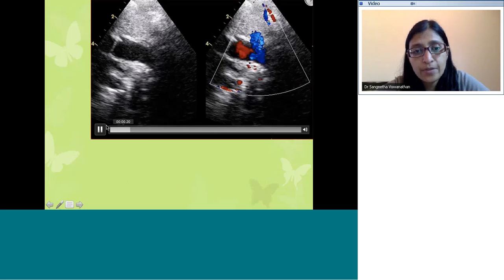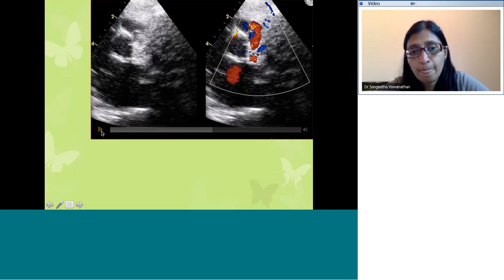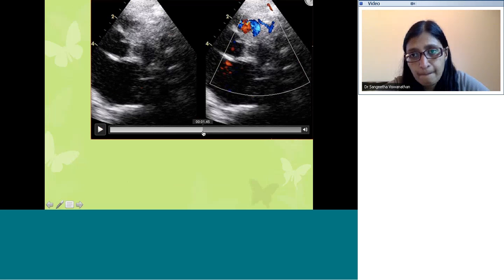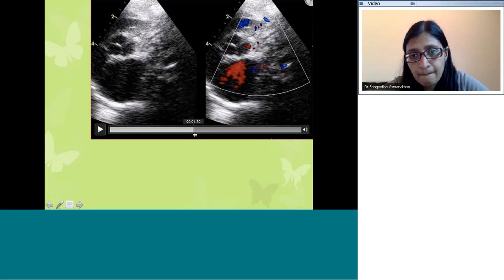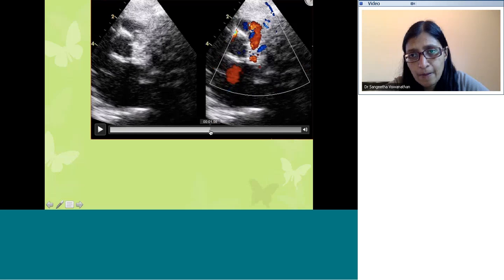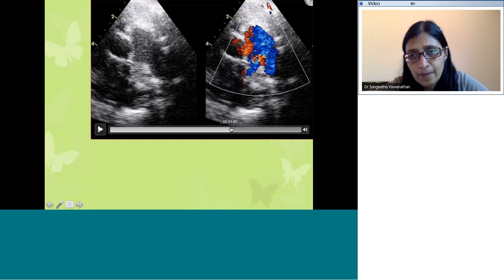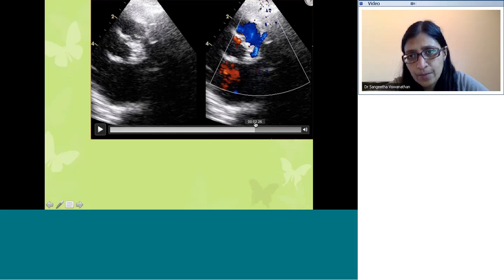Okay, let me just try and freeze it to show you what I mean. I'm not able to get it in one frame.